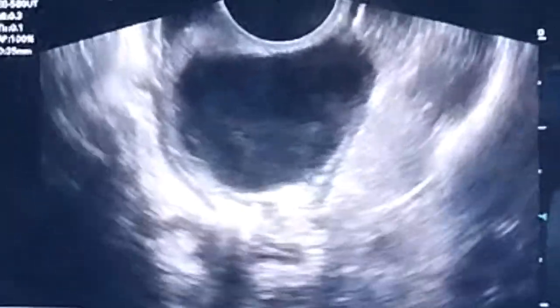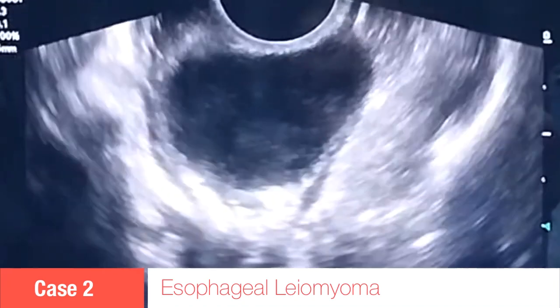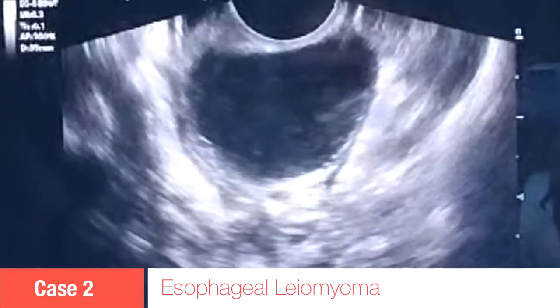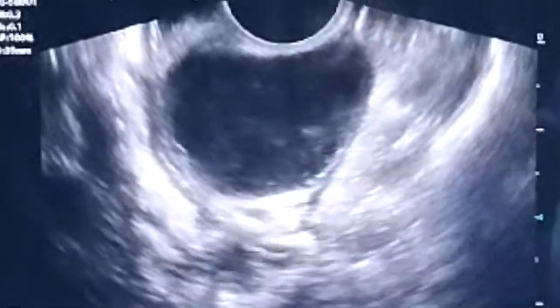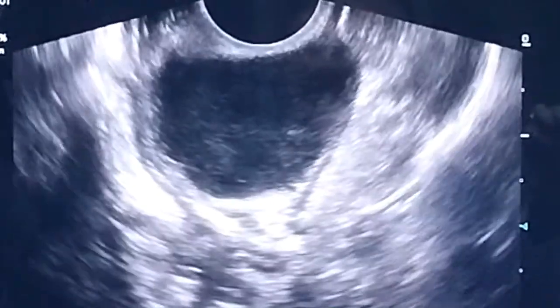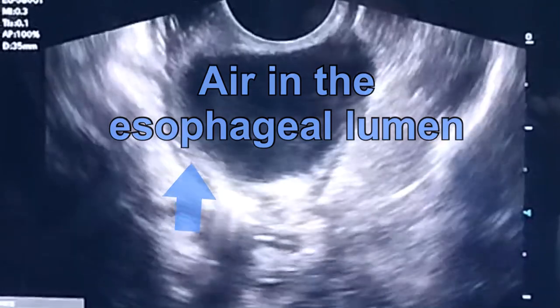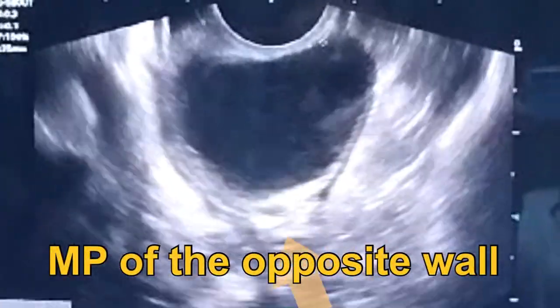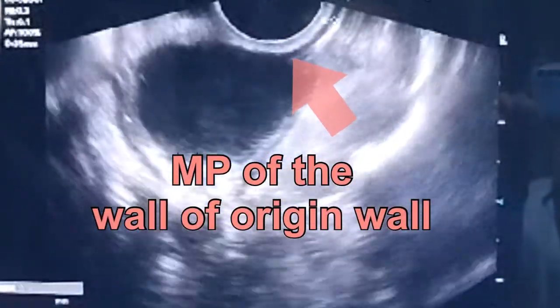Because this is deceiving, this is the double wall layering effect. This is the lumen with air inside, and this is the muscularis propria of the opposite wall. And here this is the lumen with air inside, and this is the muscularis propria of the opposite wall. But here this is the muscularis propria of the same wall, the wall of origin of the nerve.